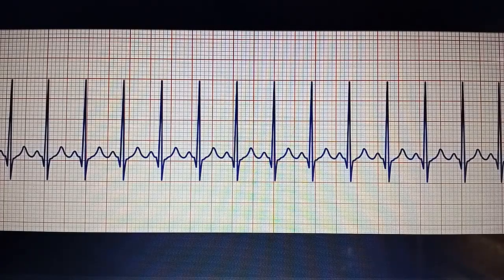So this is part 2 of our ECG series. In this video, I'm going to be sharing the classical ECG strips and certain disorders seen in the ECG.